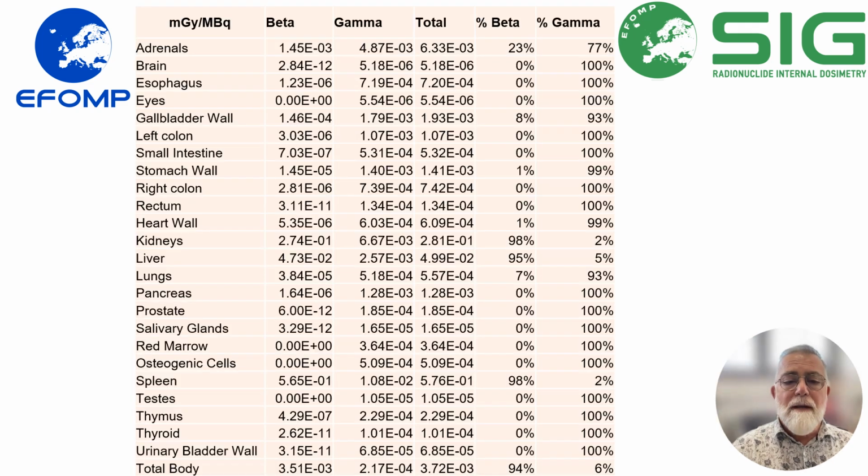So Olinda is model-based dosimetry, so you input your residence time, and then it computes automatically because it's like an Excel spreadsheet, right? So for all the possible targets, given the sources for which you input the activity or cumulated activity or residence time, you've got a computation of the absorbed dose. I just manipulated slightly the results to display for every target.